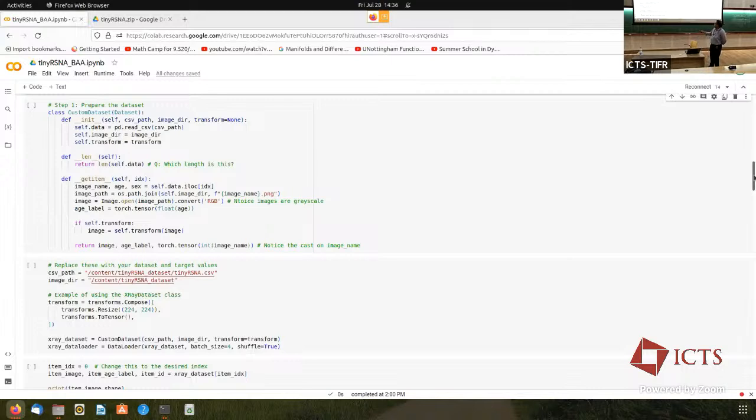Okay, now image transform. This is a very important function. If self.transform, then do self.transform on the image. This is part of the get item itself. You are allowing for the image to be transformed as you are importing it into your data set. Why do I have to do that? Because I have to resize images. Remember that neural networks will work only with 224 by 224. I'm doing a cheat of a conversion here. I am taking the image and just importing it, resizing it to 224.